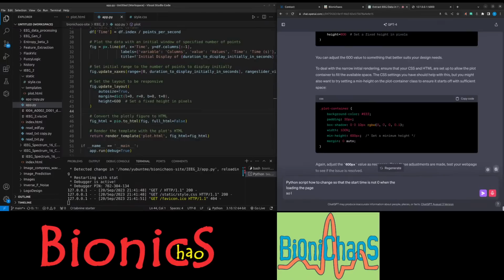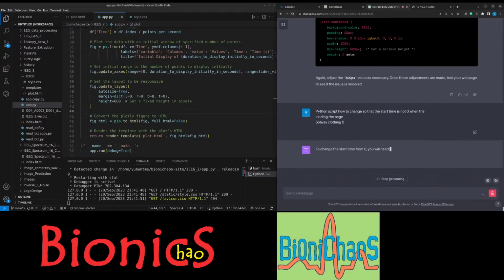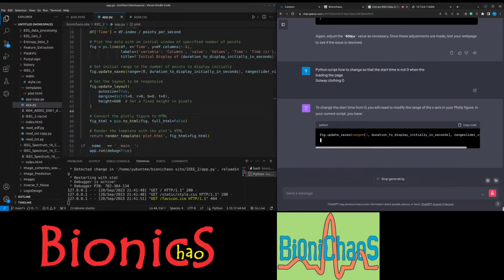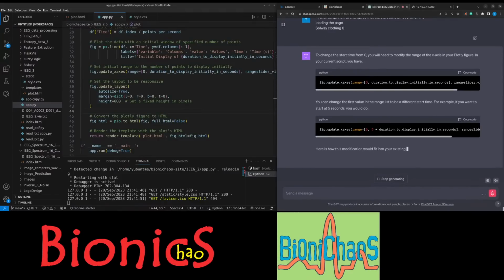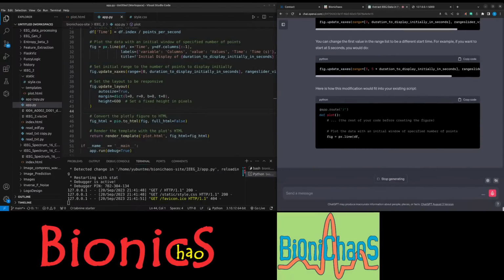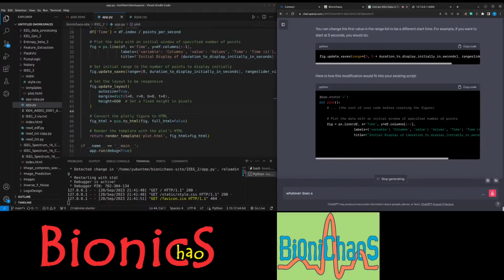It's always loading 0. And why do I have it as a variable?